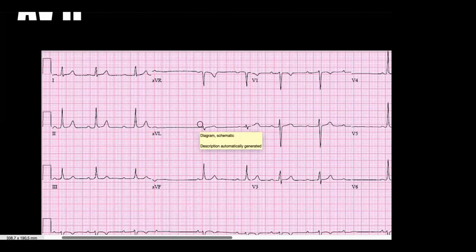So common features of the second type of AV block, you will always have the P wave, you will have the QRS complex. But if you move along, at some point, the heart just doesn't beat, it just stops. And you can classify it according to the patterns.